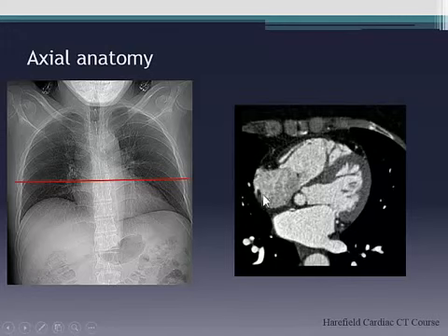You can see here, there's the crista. So the crista is that muscular band that forms between the SVC and the IVC, and that can look quite prominent, especially when you reconstruct a four-chamber, but this is a normal appearance. Here you can see the interatrial septum, and if you measure the Hounsfield unit, or the pixel intensity of this, you'll see that it's fat. CT is a very good way of identifying, for example, interatrial fat hypertrophy. And as you know, sometimes you can get confused as to whether there's a mass there or not. If you don't have easy access to MR, you can nail it on CT quite readily, because you'll be confident that it's fat.